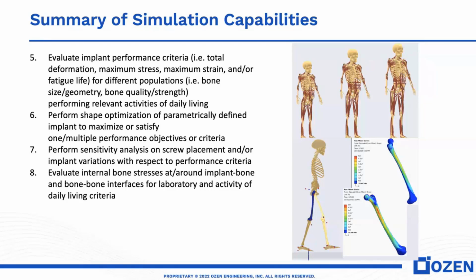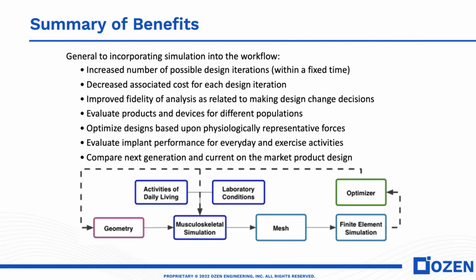And again, you can specify multi-objective criteria using the procedures that we outline here. You can also perform sensitivity analysis through this procedure as to where you should place screws, and or implant variations. And you can also look into bone stresses, since we're actually modeling the bones themselves. You can look at the bone stresses and interfaces for different activities of daily living.